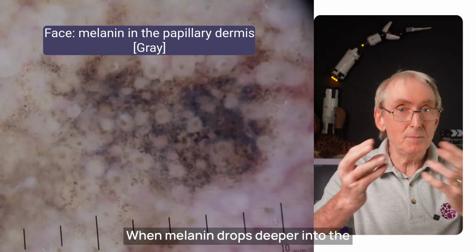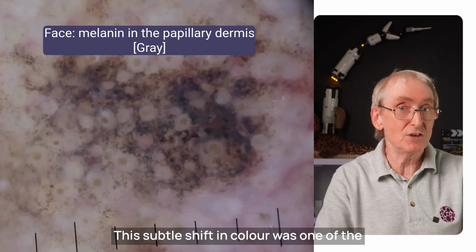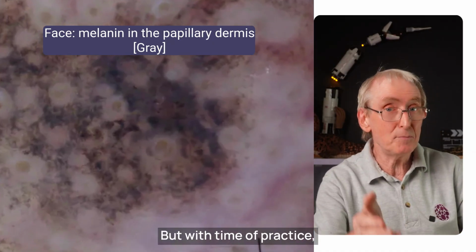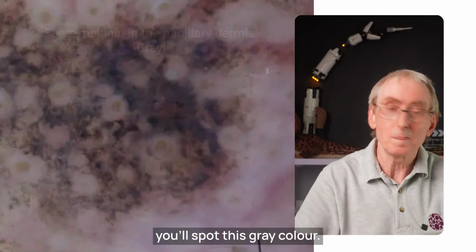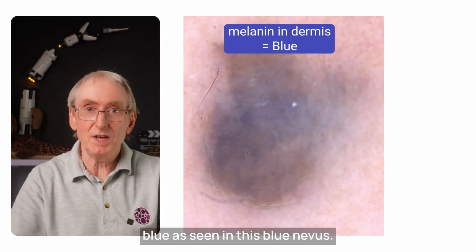When melanin drops deeper into the papillary dermis, it takes on a greyish colour. This subtle shift in colour was one of the hardest skills for me to learn to recognise, but with time and practice, you'll spot this grey colour. In the reticular dermis, melanin appears blue, as seen in this blue nevus.